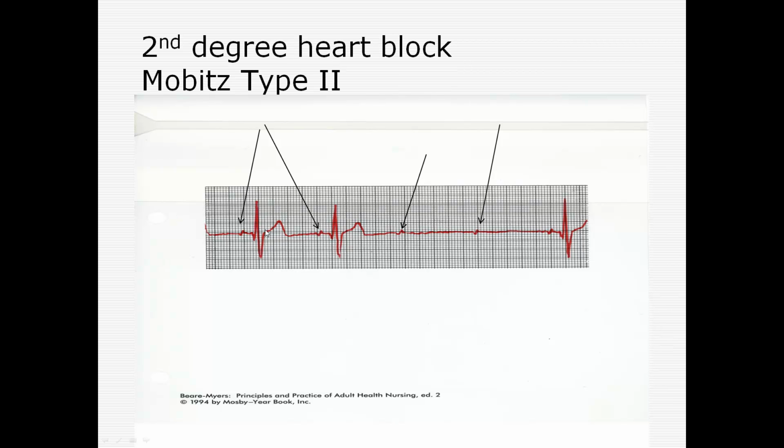And if you measured these out, this P wave is the right length of time between the PR and the QRS. So that PR interval is within the right time frame. For some reason, the AV node blocks it completely and we don't even have a QRS right here. So we're dropping beats, nothing's happening.